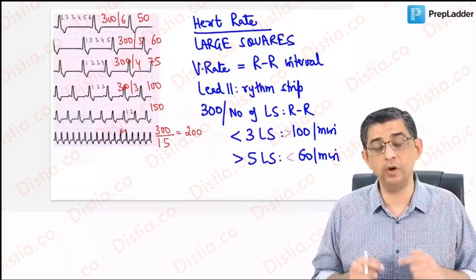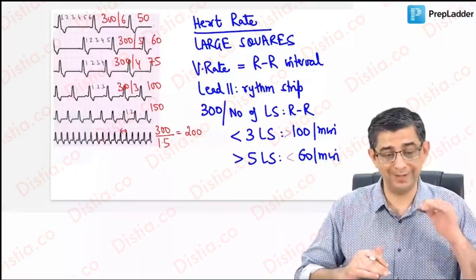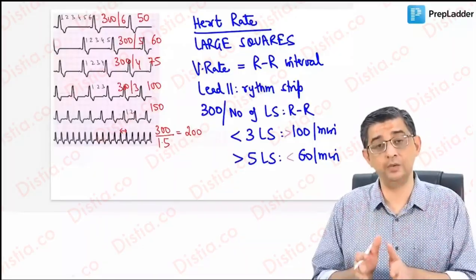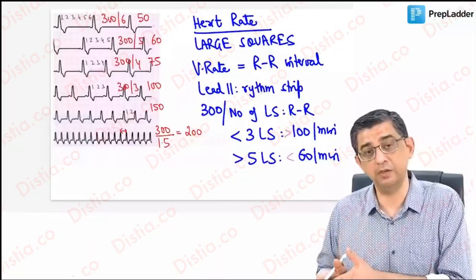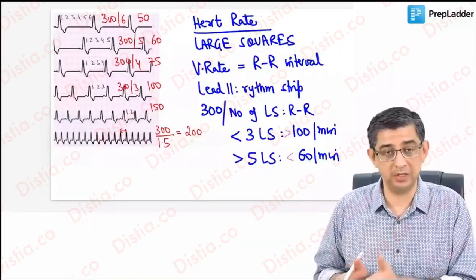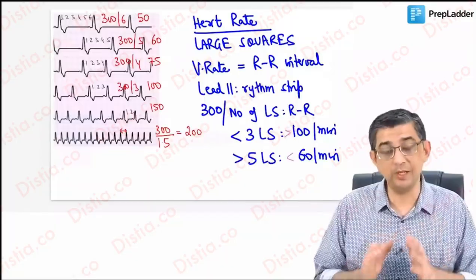So now I'm going to teach you how to evaluate the axis. We'll go stepwise, 5 seconds for each step. It's heart rate, then axis. Then we look at the P wave, we look at the height and the duration. Then subsequently, whether the P wave is followed by a QRS complex. Is there a normal sinus rhythm? Is there a drop beat present in a patient? So that comes with practice. But the first 10-second roadmap is mainly clear before you.